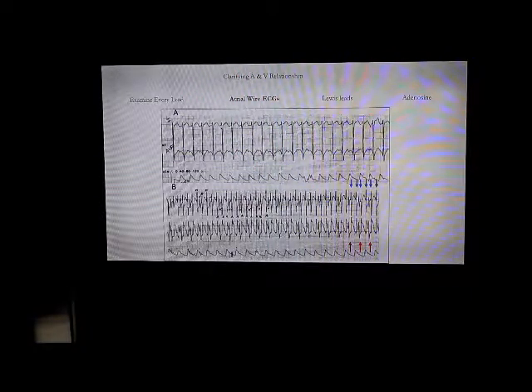So in this patient, this is what he looked like without the wires. And then when you connect the wires, you see all of these spikes are actually atrial signals. Okay. So here it's hard to tell, is this the V or is this the V? So you just correlate it to the surface lead. So here is the QRS. So this small one is the V and this is the A. So all of these are P waves. Okay. Make sense? Should I repeat? Okay.